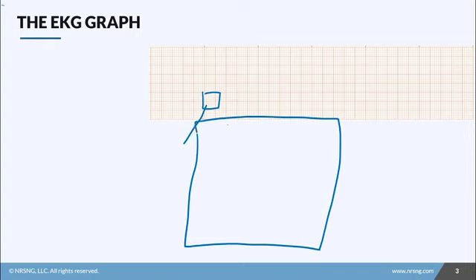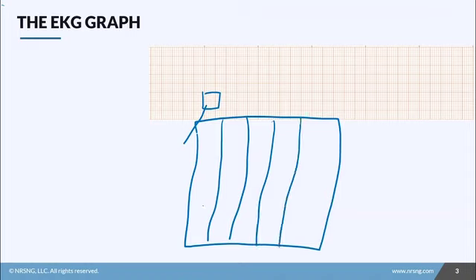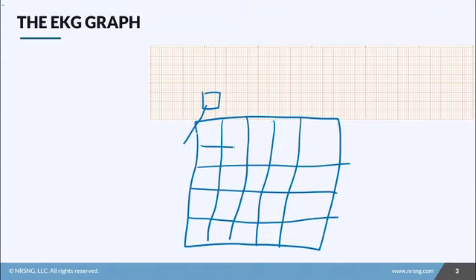Okay, so here is our big box again. I'm going to draw a picture, basically taking a chunk out of this box. Here we have our large box, and inside it we have 5 small boxes going across and 5 small boxes going up. Now, I don't want you to get confused and think there are 25 little boxes in one big box. Yes, that is true and correct. However, what we worry about is that there are 5 small boxes going across in this larger box.